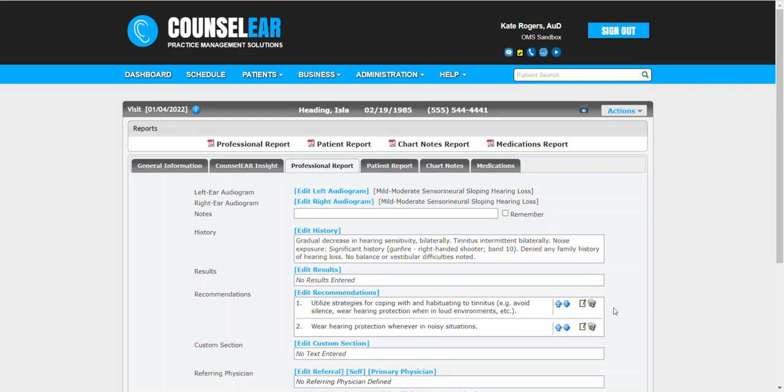In these features, we hope to give you some simple tips, tidbits, and tricks to make your days easier and your patients happier. In this feature, we're going to talk about setting a normal range on the professional report audiogram. Now, this can be done on a per visit basis, or it can be set as a default. I'll show you both methods there.